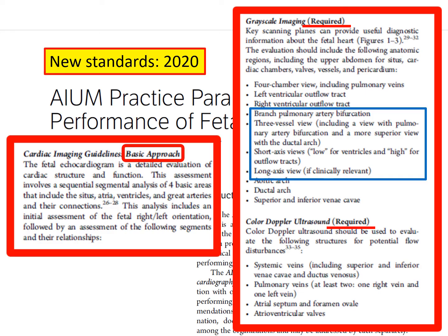Typically, our fetal cardiac scans happen in the mid to late second trimester, which is well after 20 weeks gestation. There are some early gestational scans that we do, but not before 14 weeks. And so ALARA is still in effect. We still maintain good use of ALARA in terms of our power output in the ultrasound machines. We want to minimize the amount of color and spectral Doppler that we employ in these cases, but at the same time, it's completely safe at these gestational ages for these fetuses, and it's a really important part of these scans.